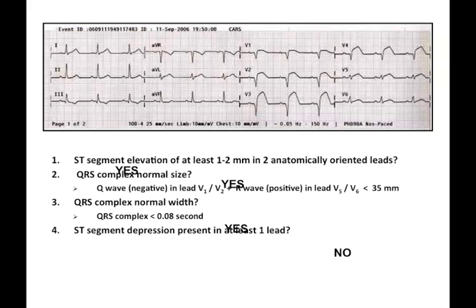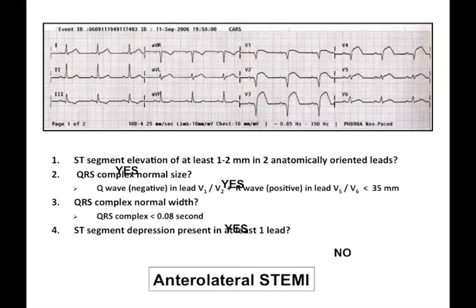So, can we diagnose STEMI in the prehospital setting? Based on this algorithm, we can't, even though this does show a large anterolateral STEMI. Remember, I told you early in this slide set that this algorithm is not intended to diagnose all STEMIs, but most. Because no reciprocal change is seen in this ECG, it makes it more difficult to diagnose STEMI for those providers that are just beginning to interpret the ECG.